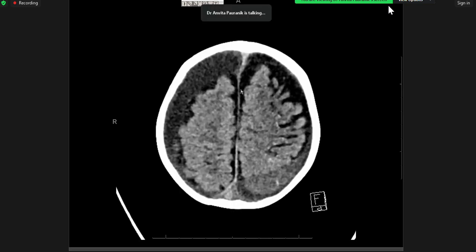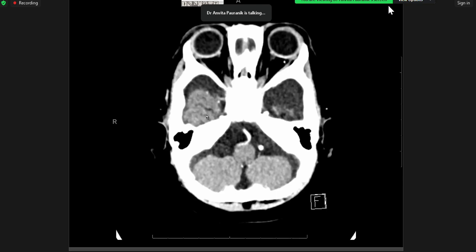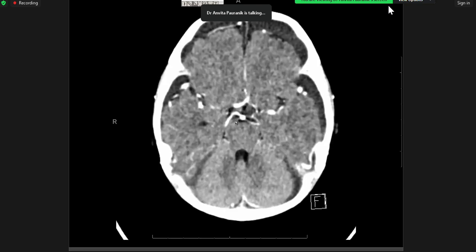All right. So this is obviously a much more florid example, and in the interest of time, I'll just tell you what's going on. But this is more like a companion case to what we saw. This patient was initially scanned at 3 months of age, and their clinical history was fussiness, oscillating mental status, focal seizure, rule out whatever's happening. And what they did was acquire only a post-contrast CT head, which is another mistake we sometimes make.